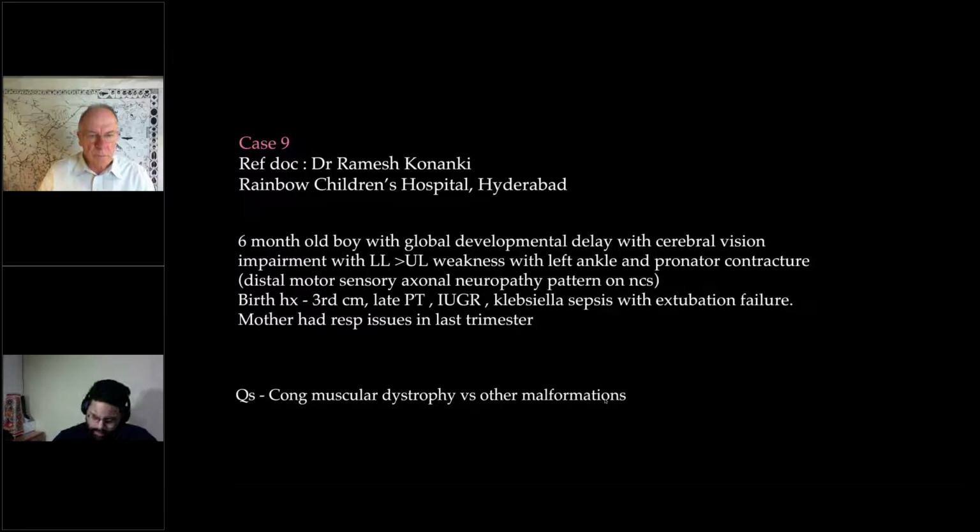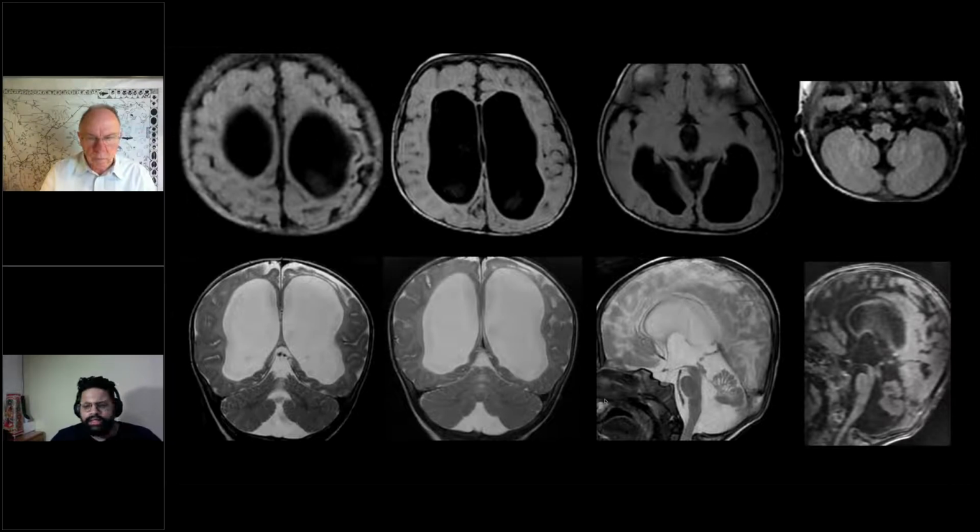No, that's all. Mainly the radiological. The child was scanned at another center, and here you have the axial T2 FLAIRs, and you can appreciate that this is severe lateral ventriculomegaly. And over here in the left high parietal region, there is some loss of the cortex or cortical thinning with some areas of gliosis in comparison to the contralateral side. The ventricles are significantly dilated.